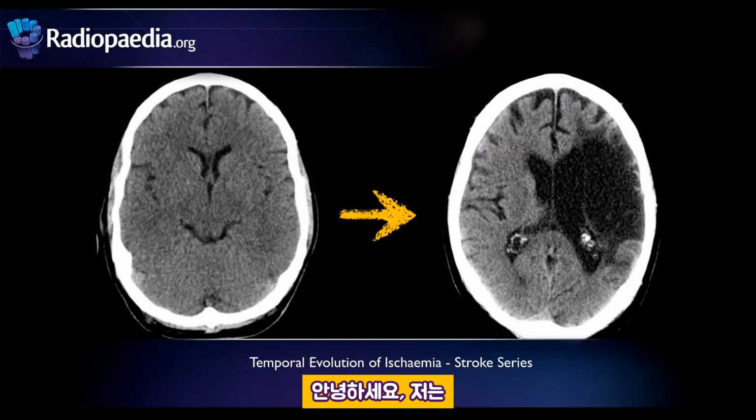Hello, this is Frank Gaillard from radiopaedia.org, and today in the fourth part of our series on imaging of stroke, we'll be having a look at the temporal evolution of ischemic strokes.